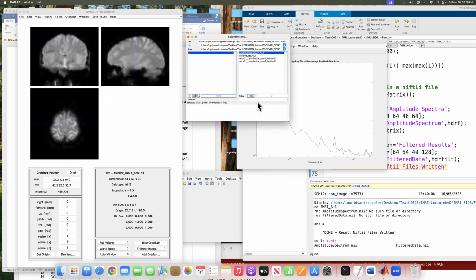We can now say, let's look at this data that we now have in the display. I'm going to pick out the run 1 data. So I say, anything that has run 1 in it. Sorry, I have to do that here. Everything that has run 1 in it here. And the rest is dot star, so that doesn't matter. I'm now typing it in like it's in the handout.